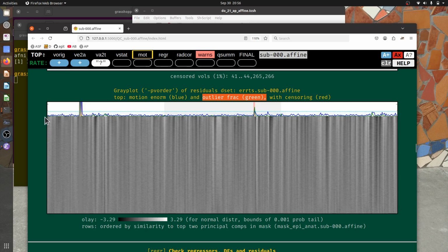But what we're seeing, as we go across here, is individual time series expressing their up and down, not as a line moving up and down, but as a coloration moving either white for up or black for down. So a flat line would be just constant gray. And as you move across here, for example, it's black here, this must be a relatively low value for this time series, then a relatively high value, then a mean, median value, lower, mean, things like that.